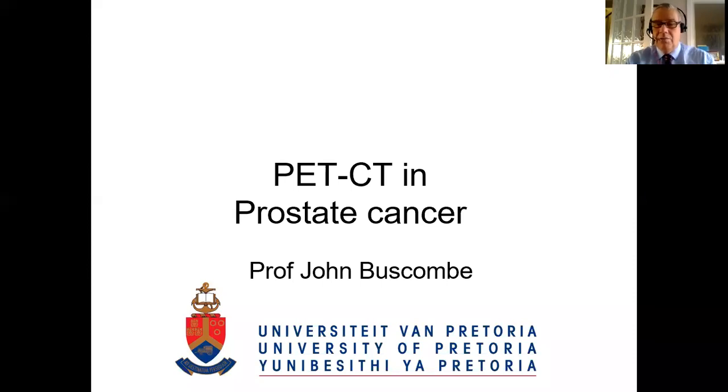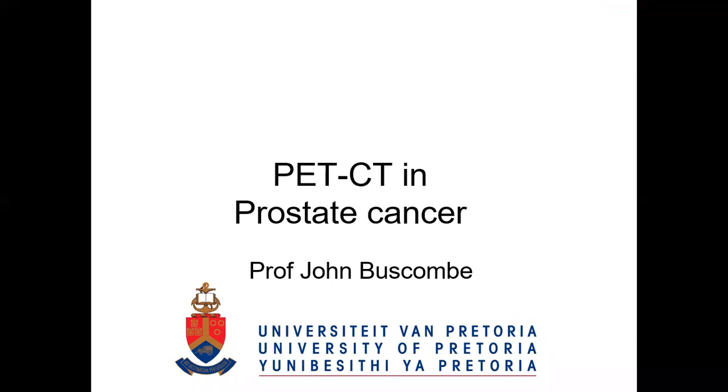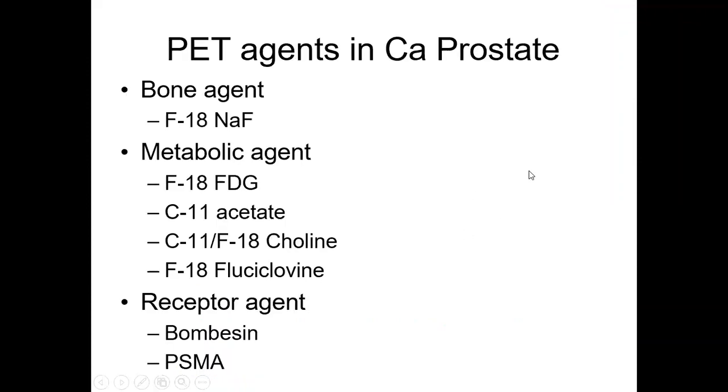We're now going to talk about PET-CT in prostate cancer, so we're going to have a look at this. Now, it's not just going to be PSMA. I'm going to talk a little bit about some of the other agents that we use as well.